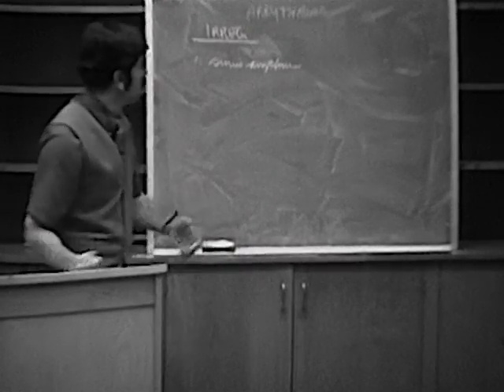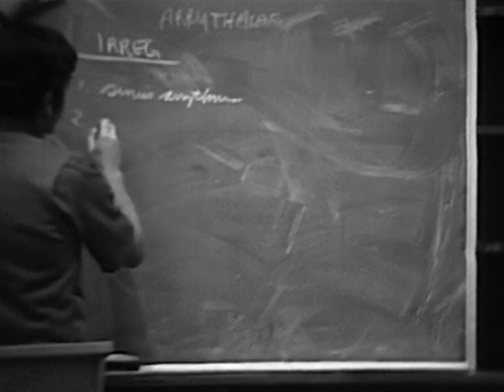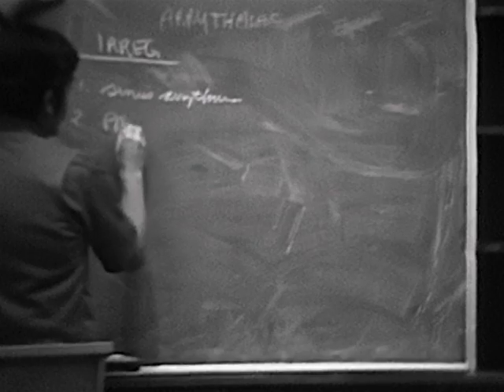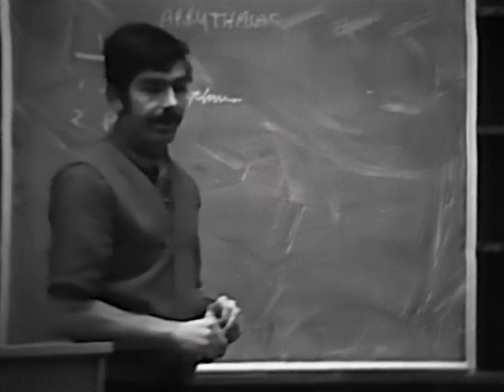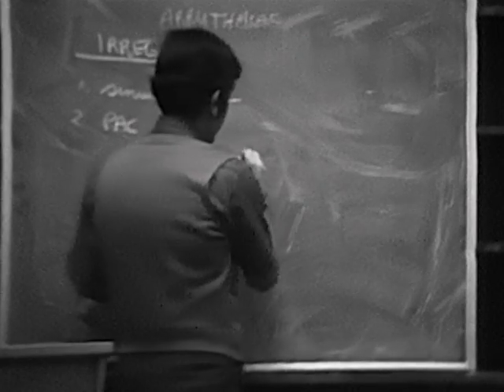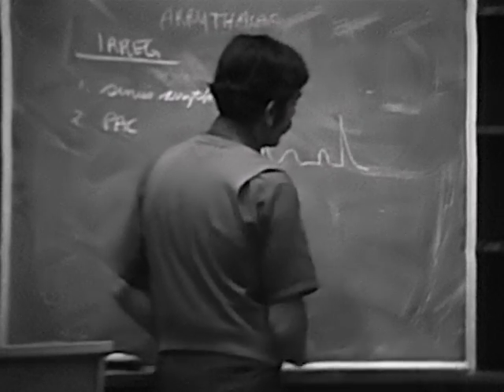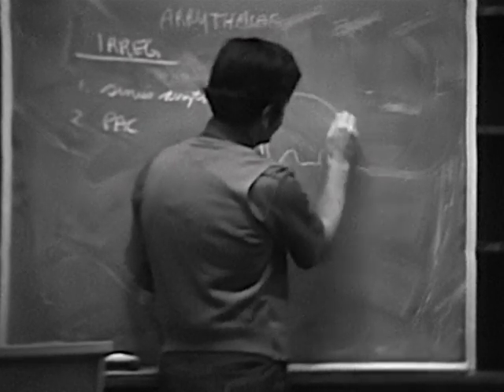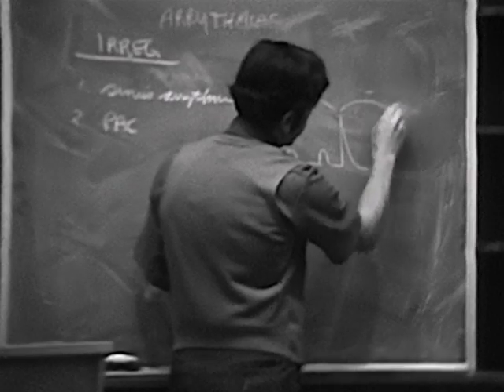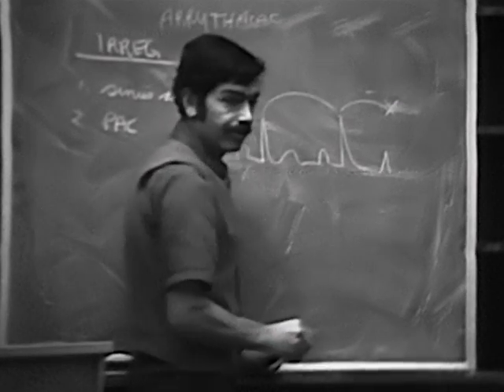Normal phenomena. Then, as you develop a little atrial irritability, we'll get an occasional premature atrial contraction. And you're aware of what they look like as you're going along your regular rate right here. And then you'll see a premature atrial beat. And generally, a premature atrial beat will be earlier. The P wave will have a slightly different configuration.